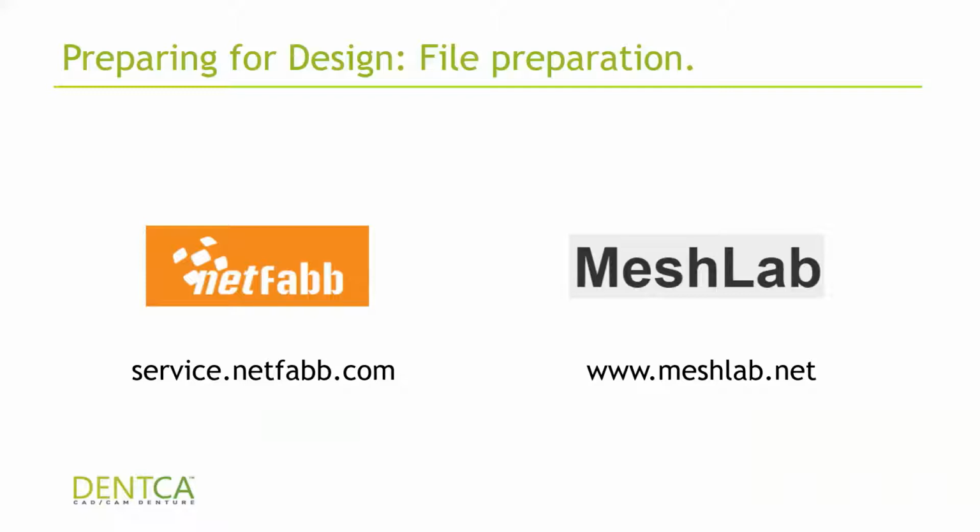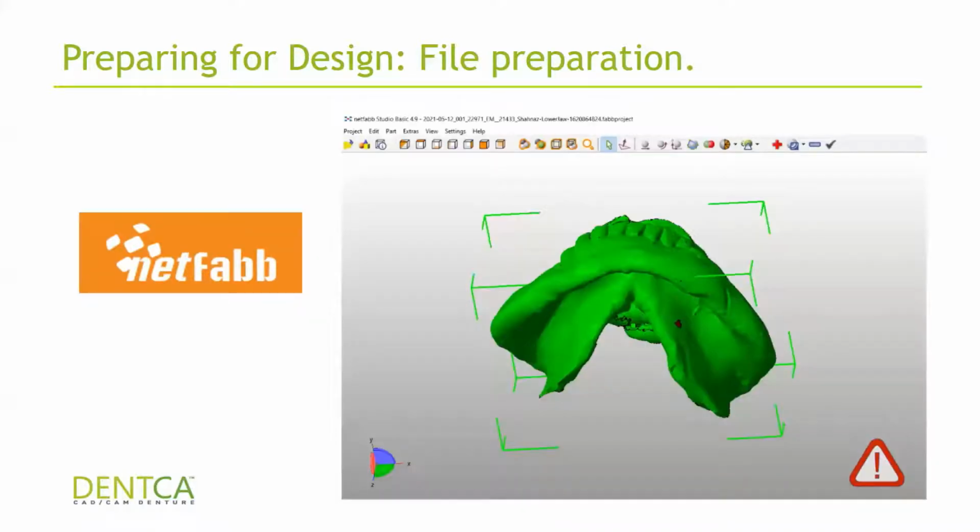All the functions that I'm going to mention are on the free version. Of course, each of these have a paid version with advanced functions, but we don't really need those. The simple things that we will do, such as patching or converting, can be done on the free versions of the softwares, and they can be found on the website addresses that you can see below each of the names, in case you want to download them yourself for your lab or your dental clinic.